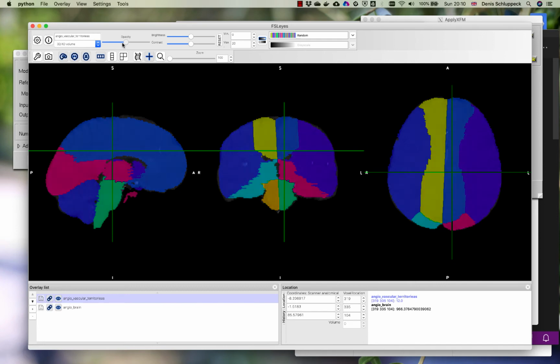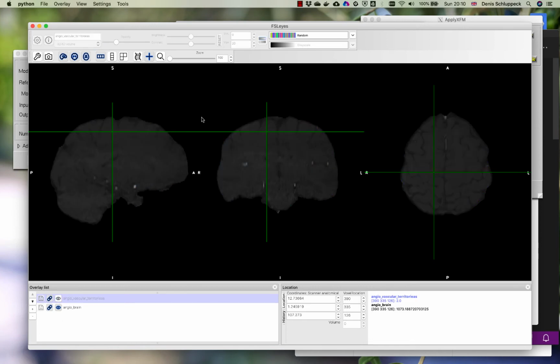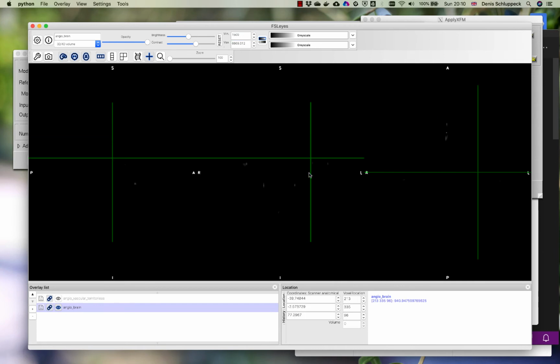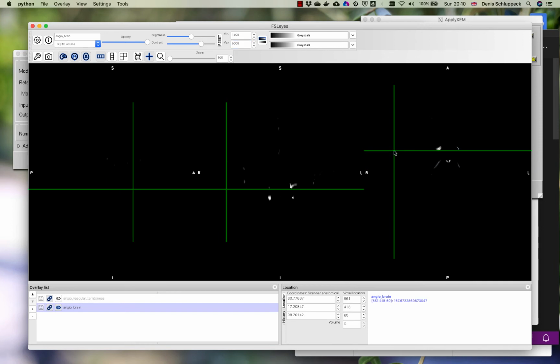And so the idea I had for this is we're going to try and identify, say, only the yellow bits in the image and carve up the original underlying image, which is the one you can see here, which, if you remember, if I change this to 1500, only contains the blood vessels. Oh, actually, that's a little bit hard to see. Maybe go to 5000, make them a bit brighter. So these are the blood vessels that you can see.